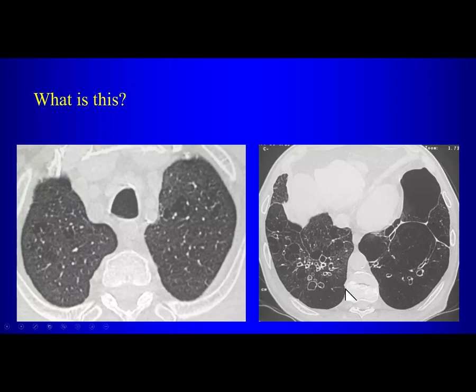That's bronchiectasis. Okay. So what do we think is going on in this patient? What kind of emphysema do you think this is? There are different types of emphysema, right? What kind is this? Panacinar, panlobular. Why? It looks like it's also affecting the periphery as well as the central. Well, what's the most common type of emphysema? Central lobular, which is caused by smoking. Central lobular emphysema.